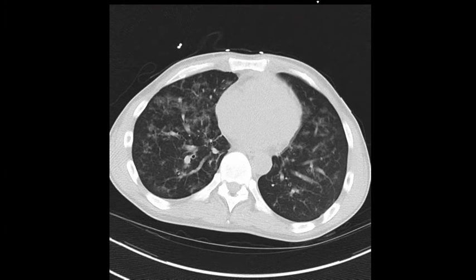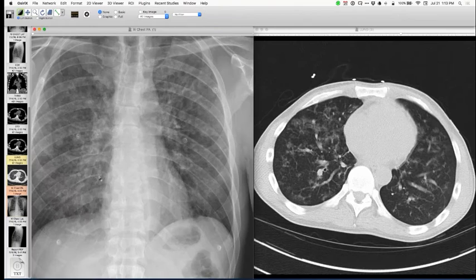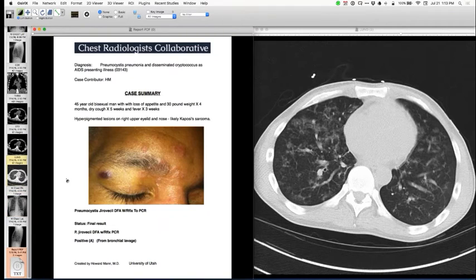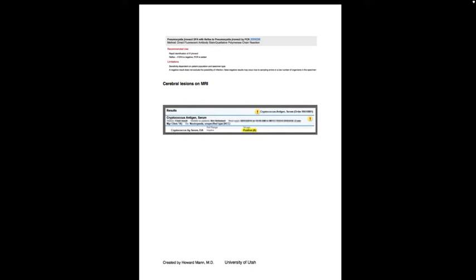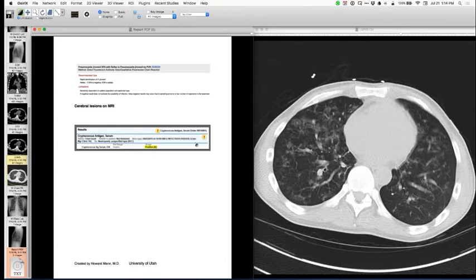And then I noticed that he was lymphopenic. And in summary, this is a patient who was then diagnosed with AIDS. Here you can see a lesion that they were concerned about, Kaposi sarcoma. Yes, he does have pneumocystis. And interestingly, he had symptoms or signs of a meningitis. And here is a Cryptococcus antigen from serum, and I think there may have been one from CSF that was positive. So based on that, he also has Cryptococcus.